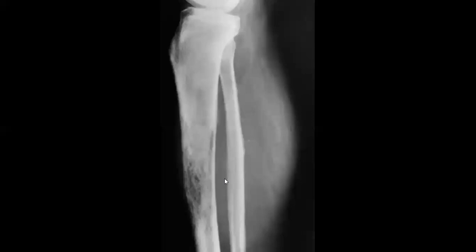Perfect. Infection, osteomyelitis, will be one of the good differentials. Multiple myeloma, I don't think so, but you could put it at the end. But maybe metastasis. If MM is mentioned it means multiple myeloma, but I think you mean metastasis. Yes, aggressive. Ewing, perfect, it's fine to mention that it could be Ewing. Lymphoma again, yes, okay.